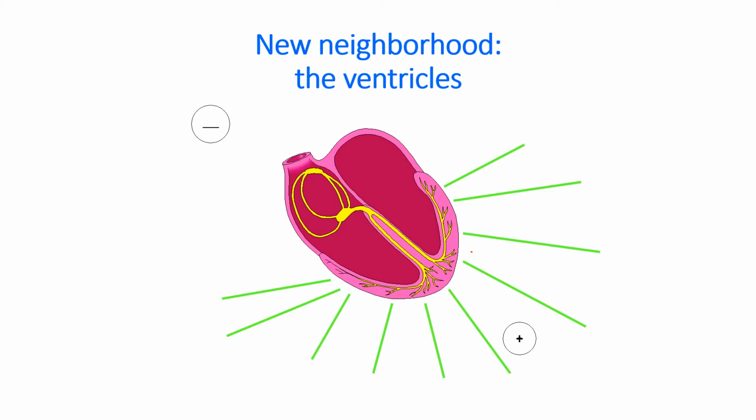And again, it takes longer for those QRSs, because the depolarization of those ventricles is not going down the bundles of His at the same time, giving you that normal QRS. And also, usually if it comes from the ventricle, you're going to see a T wave in the opposite direction of your QRS.